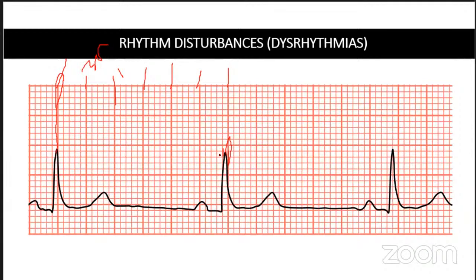it's an estimate of the patient's heart rate, but at least getting 50 something tells us that this patient's rhythm is what? A bradycardic rhythm. So again, that's why it's very important that you are able to identify what the rate is. So this tells you this patient's rhythm is a bradycardic rhythm.